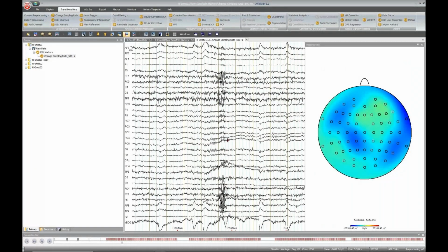And here, if I try in this state of the data to drag the cursor, I see that nothing is happening. So the values seem to be changing, however, in the map, there is no large change. So if I also try to make an area and drag it around, I can also see that there is no change in the map.